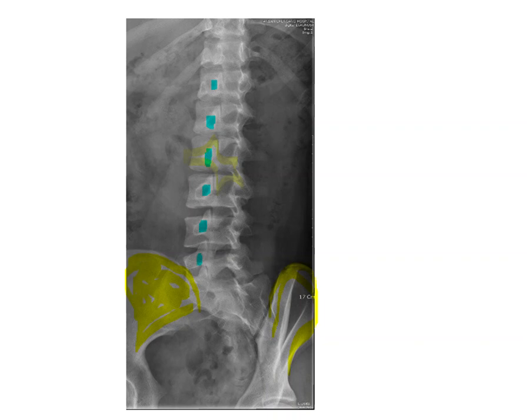So then let me see, I'm going to go ahead and draw in his ear. That would be his ear. This would be his nose. Inferiorly will be his leg, his front leg.